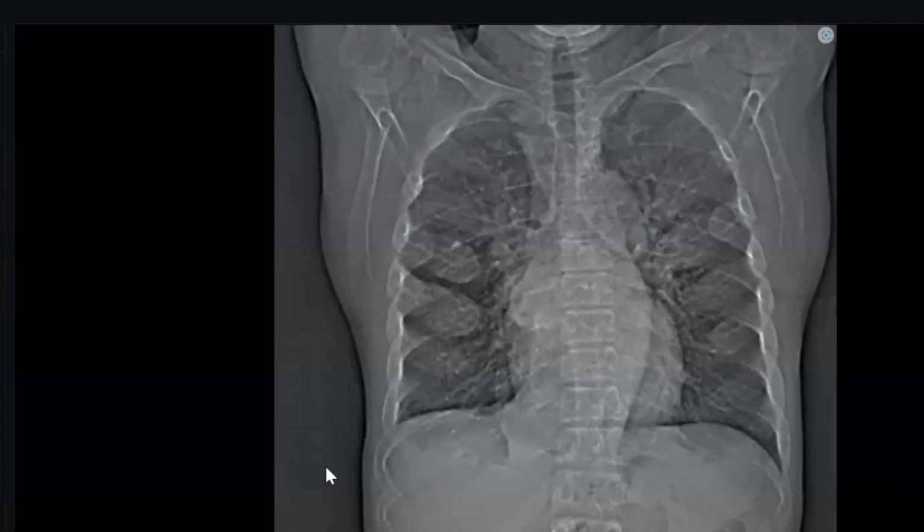Okay, there is anterior bulbous enlargement of the anterior ribs, and the vertebrae show, I'm looking for the presence of any H vertebra, and there is no snow capping of the humeral head.